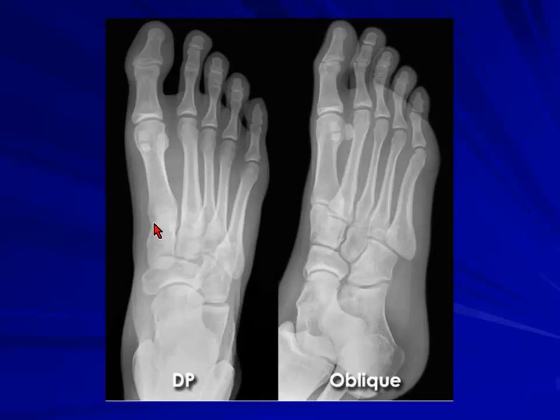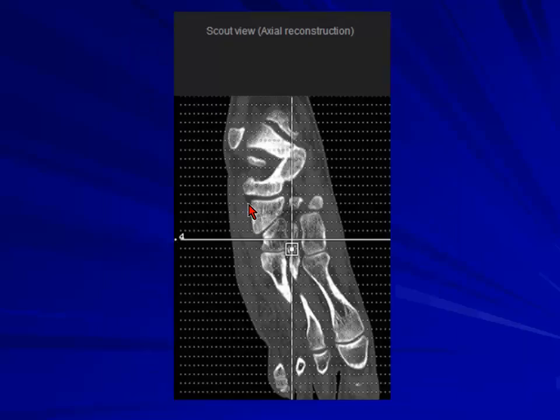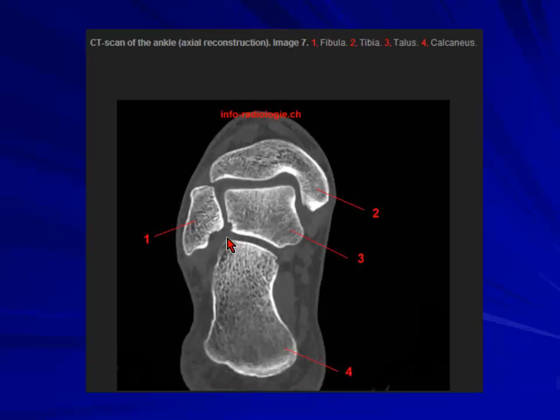Again, looking at the anatomy is exactly the same as the hand. You've got joint space, you've got the cartilage, and you need to look and describe the articular cartilage, joint space, and whatever the joints are involved and the pathology related to it. So looking at the CT, this is how it will be. You'll have axial, coronal, and sagittal. So again, it shows the articulation.